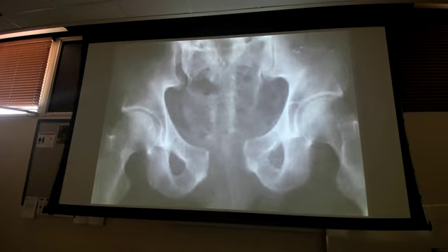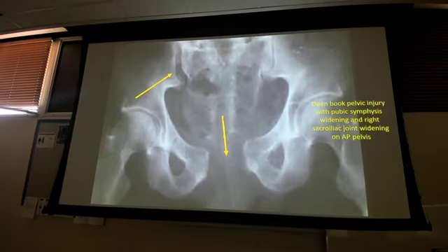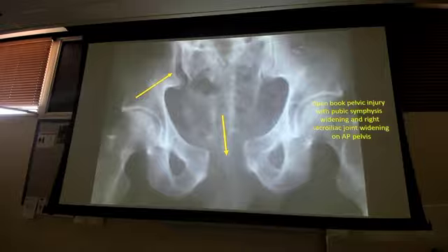What would you guys answer? Open book pelvic injury or pubic symphysis, SI joint?